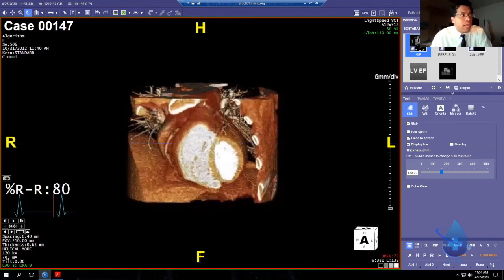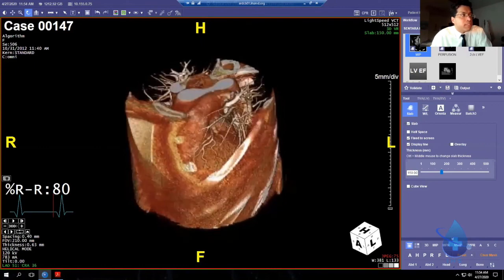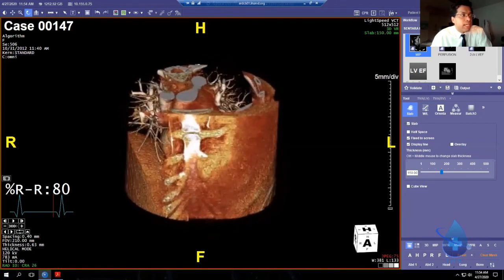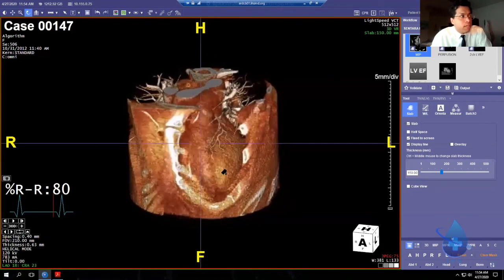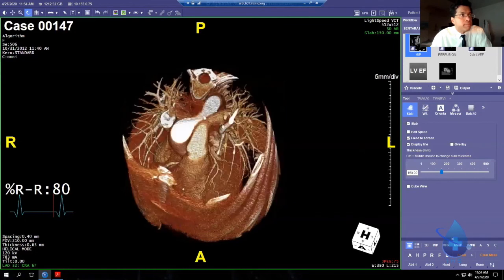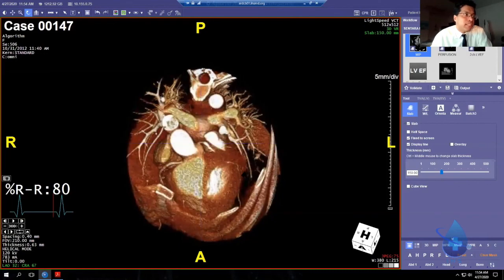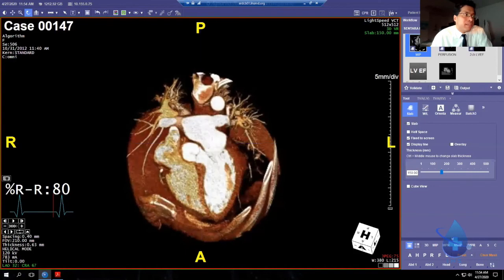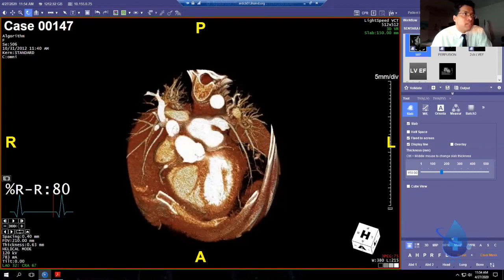So in this way, the entire matrix of CT density cubes that was scanned is accessible to you in the heart, outside the heart, surface of the heart, orientation. So that's cut plane. And remember, there's one little bug in the software, and that sometimes you're trying to cut and it's locked. Like you see the razor blade, but it's locked like this. You have to click this slab button twice and it'll work. I hope they got that bug out in the software.